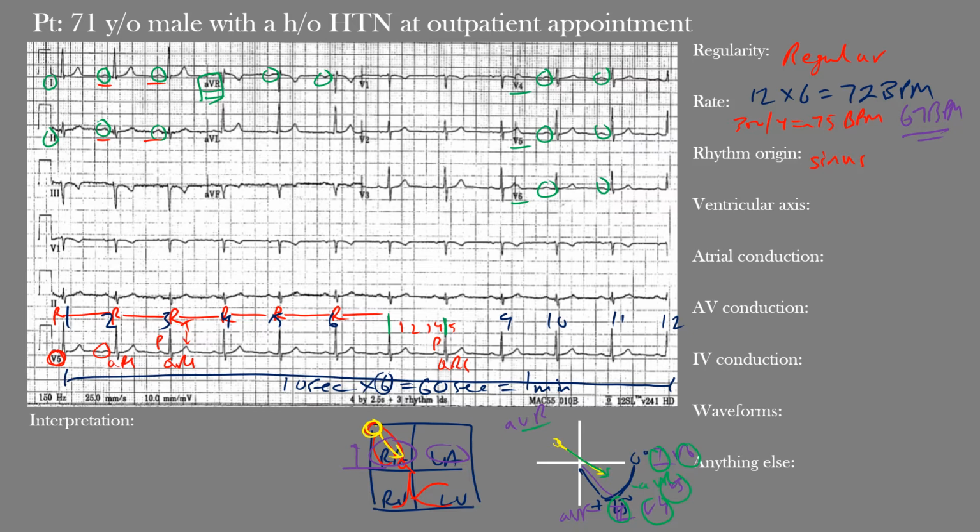Let's look at the ventricular or QRS axis now. So now we're looking at the electrical axis, and you should have gotten a QRS axis that is shifted leftward but still within the normal QRS axis range. The actual value here was negative 27 degrees, so I'll write that here. Okay, so negative 27 degrees.